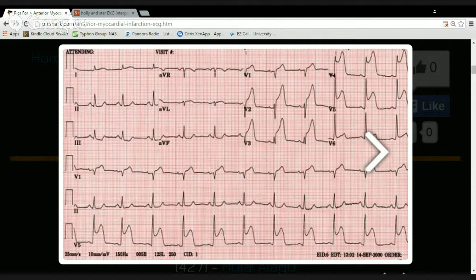In summary, this patient is in normal sinus rhythm at a rate of 75 beats per minute. There are P waves for every QRS complex. The axis is normal. There is no ventricular or atrial hypertrophy. There is no T wave inversion. The ST elevation is in leads V1 through V6 with no pathological Q waves. The patient has an anterior acute MI, which is affecting the LAD.